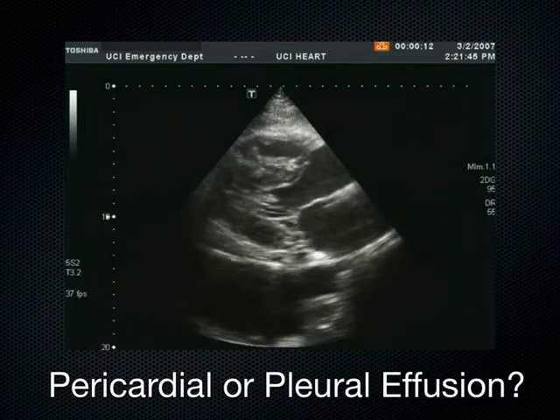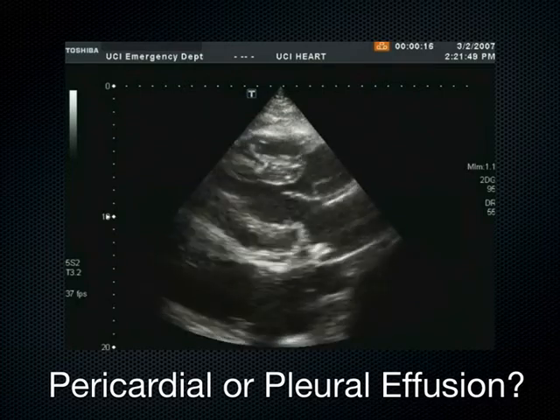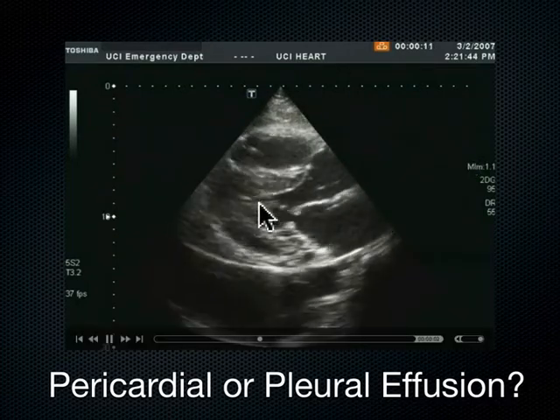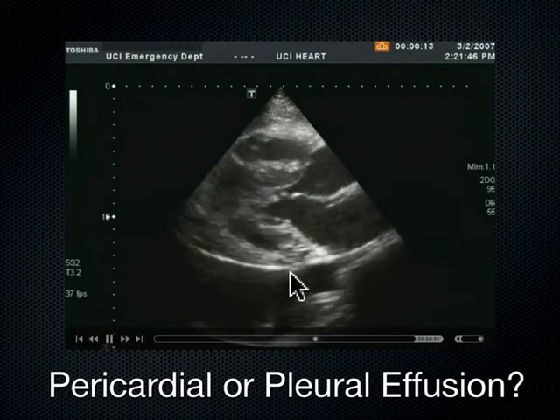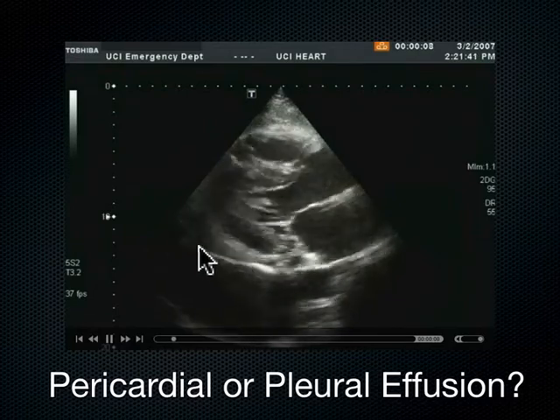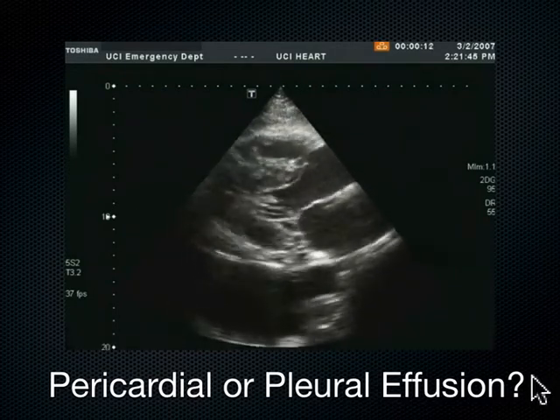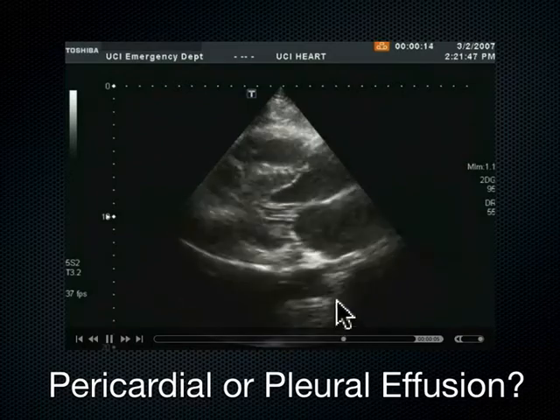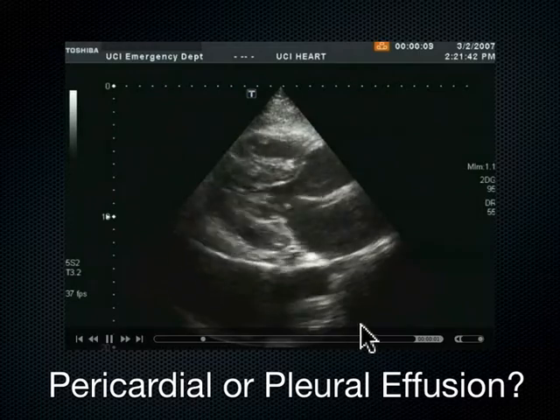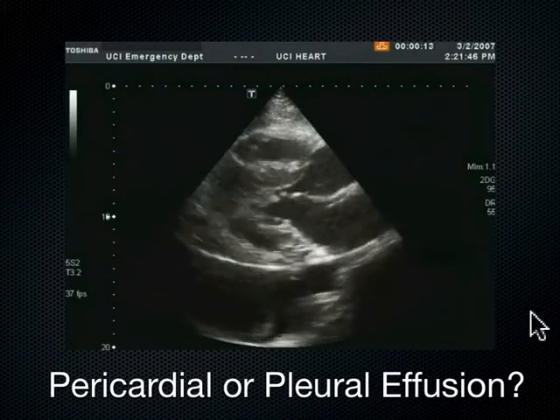Okay, last slide. Is this second to last slide? Is this pericardial or pleural effusion? This is the parasternal long axis of the heart, RV, LV, LA. Okay, the myocardium is back here. Is that also the pericardium? Is that white line the pericardium or not? The answer is yes. This is posterior to the descending aorta. This fluid comes along, as Dr. Landorf is saying here, posterior to the descending aorta, and therefore, this is a pleural effusion.